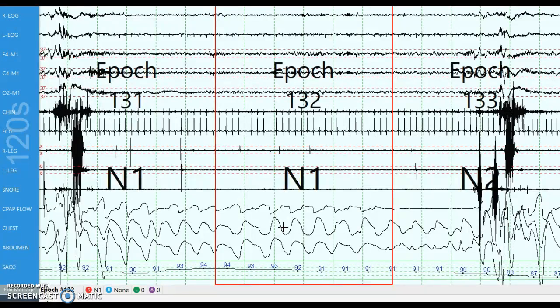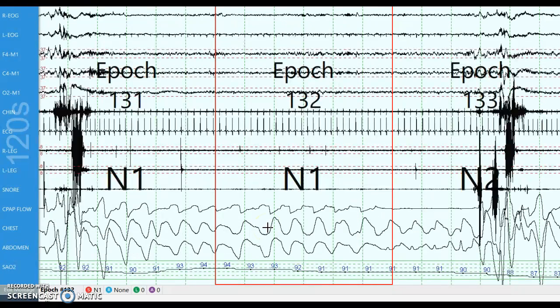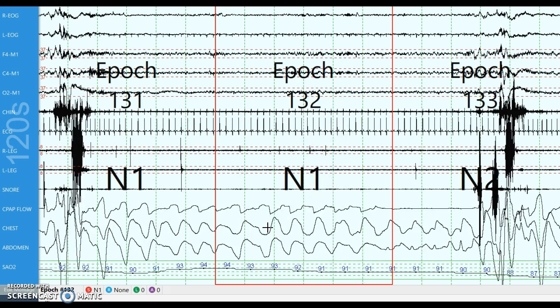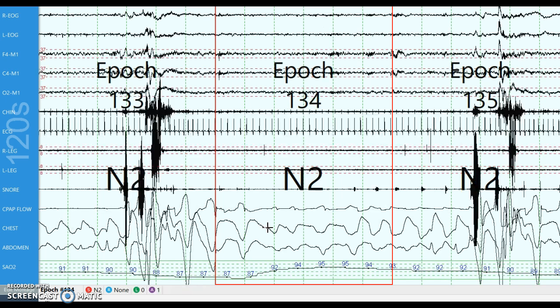So we're going to move to one that we can clearly see. Okay, here we go. We're at 94 here, and then the airflow is flat at the top, and then there's still some movement. What that means is there's an obstructive apnea here. And we go from a 94 saturation all the way down to an 87. So what you see here is an obstructive apnea, and it's also here where the DSAT is. You mark them both.